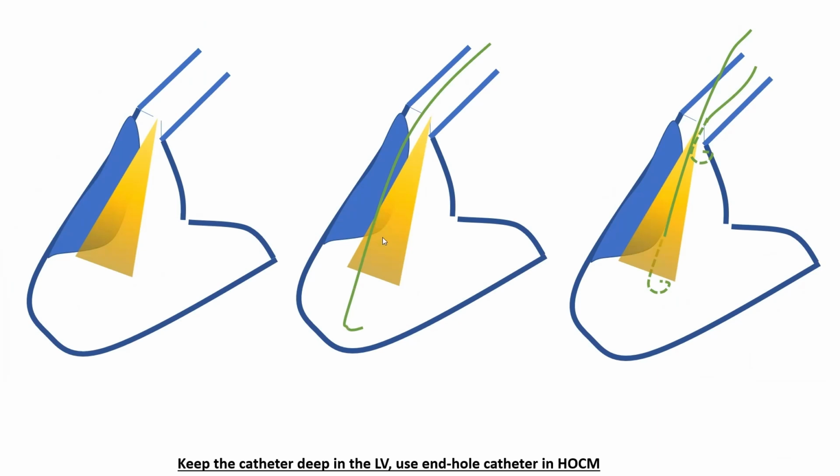So you pull and you see the LV pressure drops within the left ventricle before you get into the aorta. You see gradient inside the left ventricle. And or if you didn't have a gradient at rest, you reach a point within that left ventricle where dynamic maneuvers make no difference anymore. So you're past the point of obstruction.